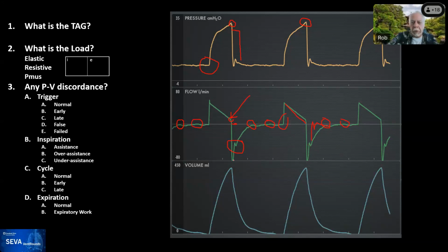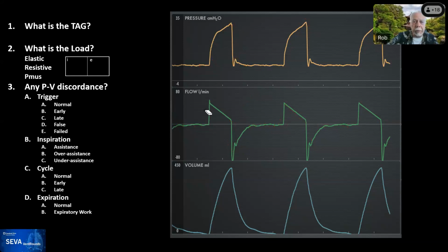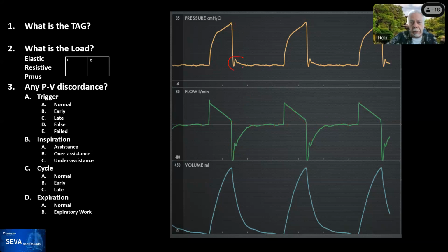The flow and the pressure change so fast that the ventilator is trying to maintain PEEP, and its control system is not perfect. So its control system oftentimes can't handle it, and you will see this sort of oscillation. There's not really any information to be picked up from that. This here and this here.